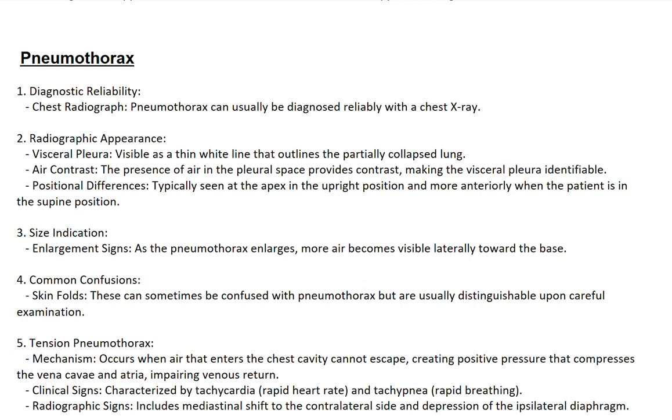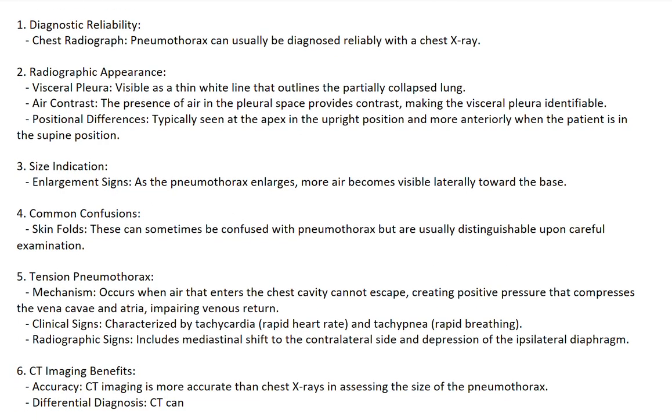4. Common confusion. Skin folds. These can sometimes be confused with pneumothorax, but are usually distinguishable upon careful examination. 5. Tension pneumothorax. Mechanism: occurs when air that enters the chest cavity cannot escape, creating positive pressure that compresses the vena cavae and atria, impairing venous return.